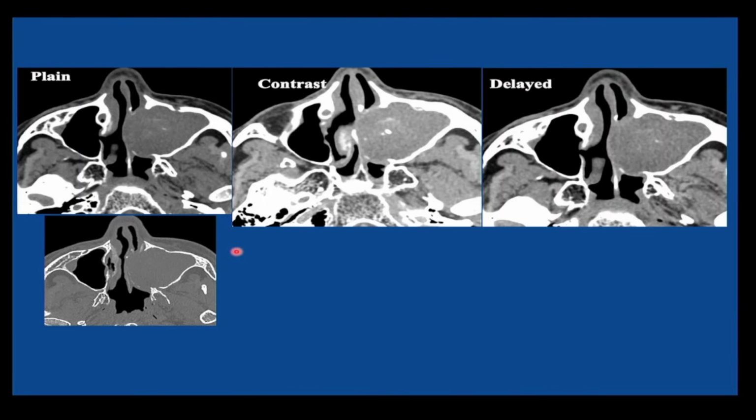Whereas, look at this. How is this? A well-behaved child, correct? Sitting in its own place. Now this is many times called an antrochoanal polyp or antral polyp. It is not reaching the posterior choana as yet. So there is soft tissue opacification in the maxillary sinus completely. But what is eroded? Whenever the medial wall is eroded, think of inverted papilloma. And with contrast, there is hardly any enhancement. This is what I was talking about, the bony strut. So this is where the bony strut is seen.